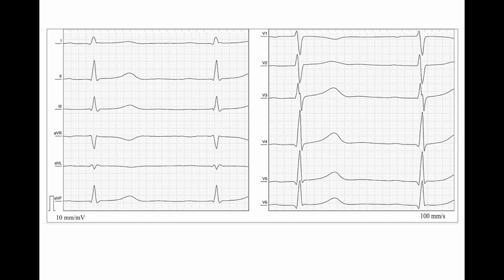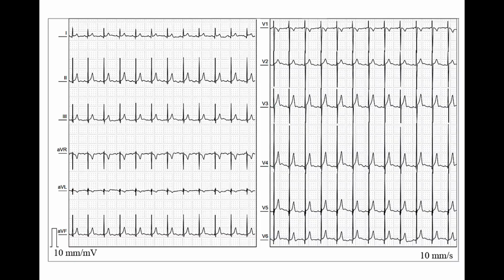The ECG recorded at the paper speed of 100 mm per second is mainly used for endocardial ECG recording. QRS complexes, P waves, and T waves seem to be extremely prolonged at the paper speed of 100 mm per second. Notches in the QRS complex, bifid P waves are easily detected at higher paper speeds. There is the impression of a slow heart rate.